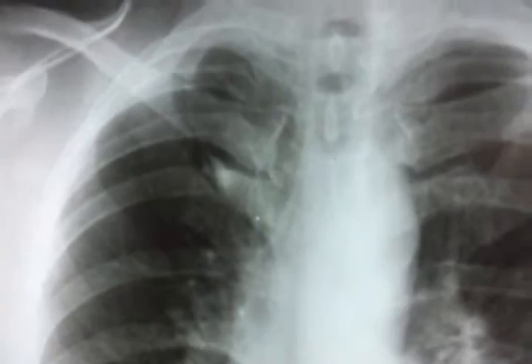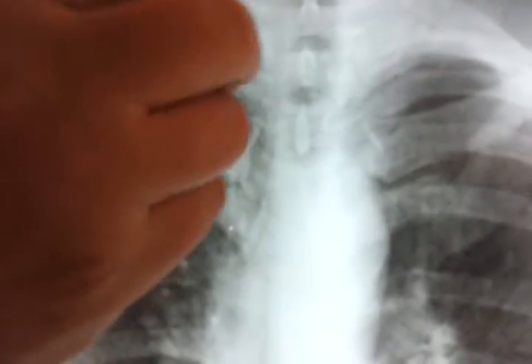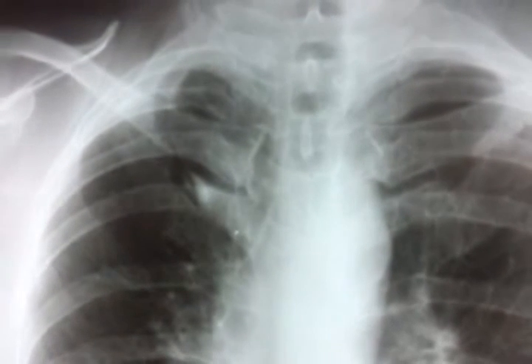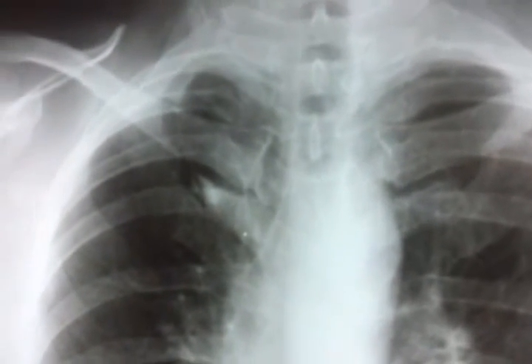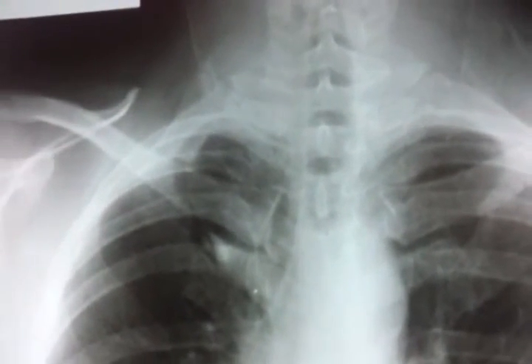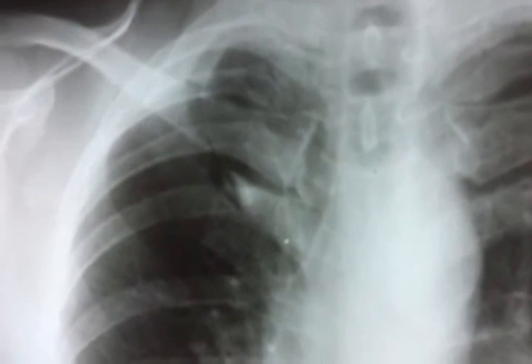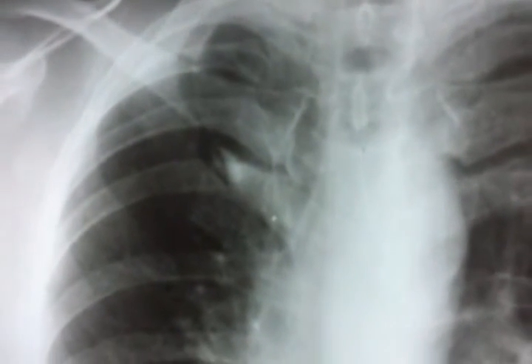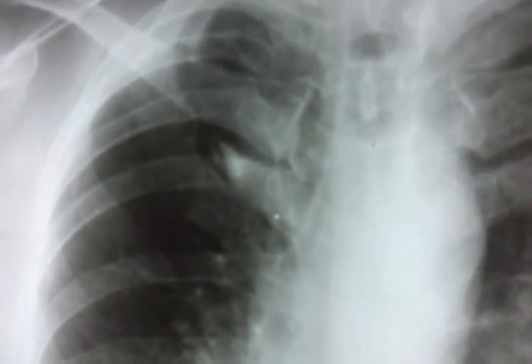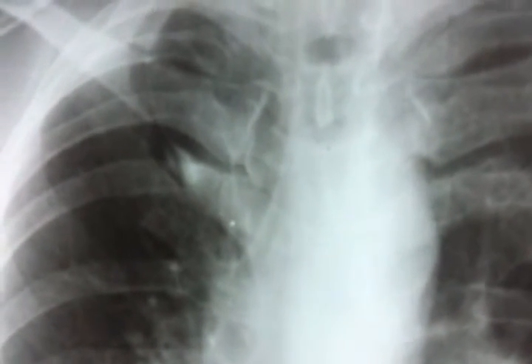Therefore, most probably this is a dirty chest X-ray of a chronic bronchitic patient with thyroid enlargement, might be thyrotoxicosis, Graves' disease. I asked you to point to an azygos fissure. Yes, an azygos fissure usually occurs on the right. It is rare in the chest X-ray. The prevalence of it is less than 0.1%.